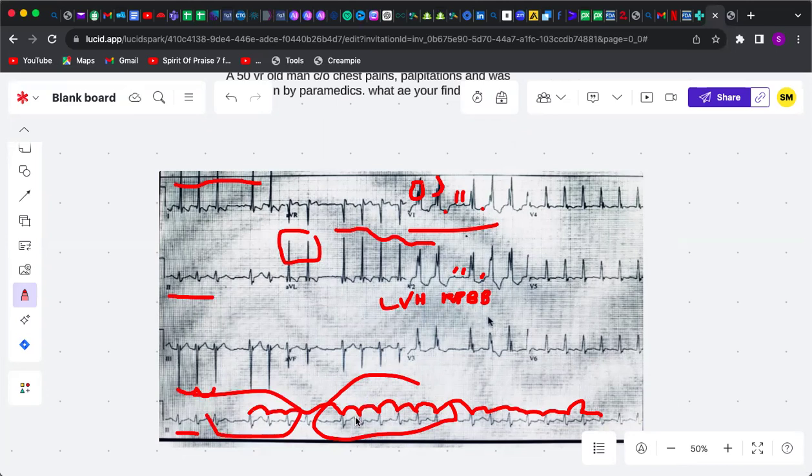Then you should know that it's a variable conduction going on, right? In atrial flutter you could have overall irregular rhythms, but whenever you're having these patches, the regular, irregular, regular, irregular thing going on, then you should know that there's a variable conduction going on there.